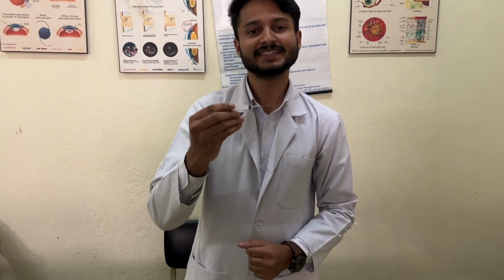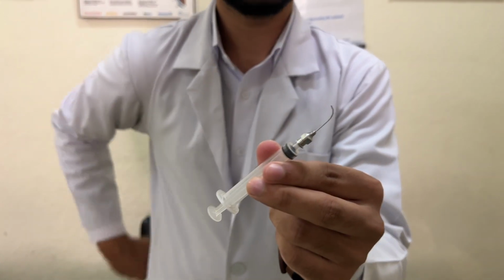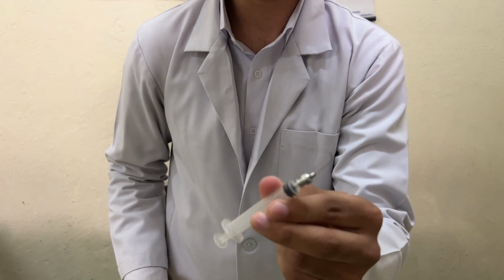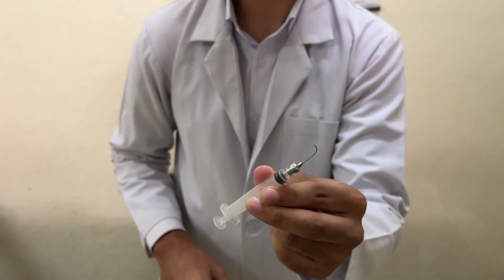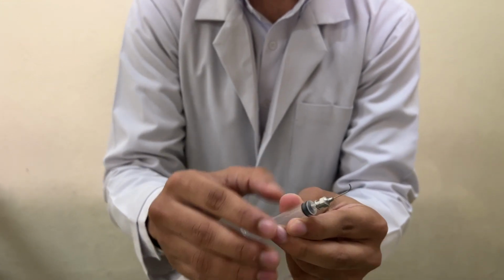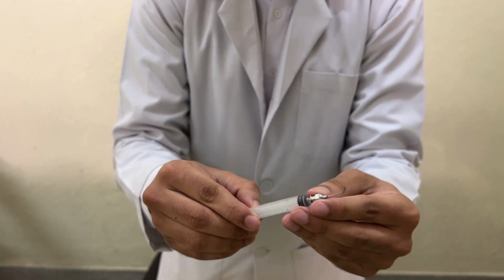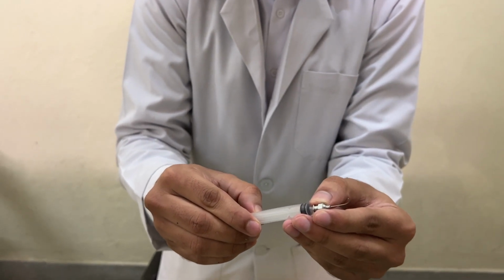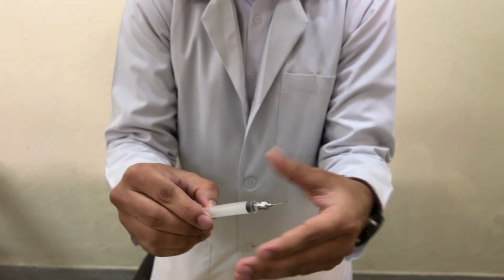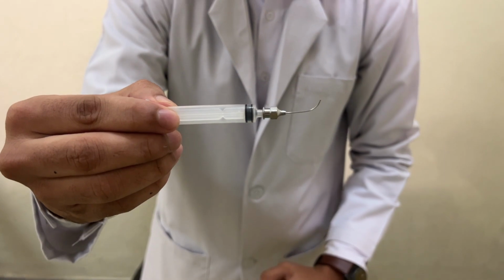So this is our AC cannula. As you can see, this portion is the AC cannula, and it should be differentiated from the lacrimal cannula in that the lacrimal cannula is made of plastic, but this AC cannula is made of steel metal, and we can see it has an opening at this point. Through this opening we can put intracameral drugs in the anterior chamber. We can also do hydrodissection with this instrument, and there are many more uses as I have mentioned in the video. So you can see this is an AC cannula.